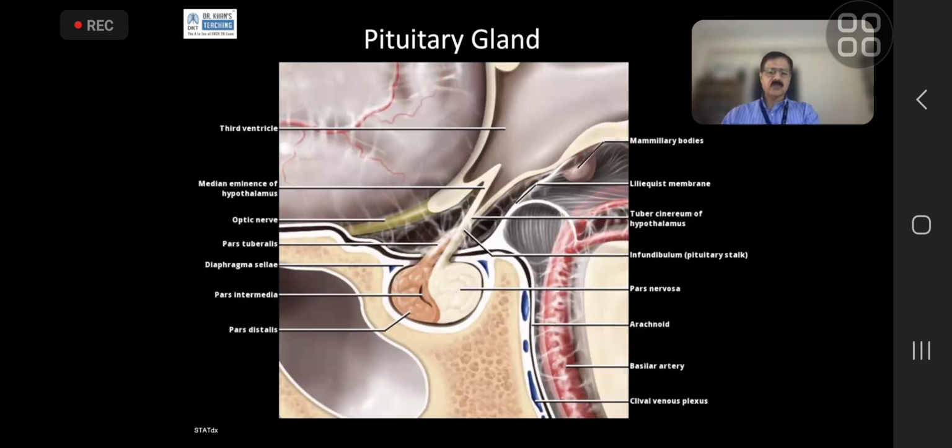From here, in this particular case, there was another differential diagnosis. Infundibular or suprasellar lesions, that's another. So this is the infundibulum. This is the floor of the third ventricle. This is optic chiasma. This is hypothalamus. There are various names here which you can remember. For example, tuber cinereum, and there is a perforated substance. No need of remembering that. Mamillary bodies you can make out, but just remember it as hypothalamus. So this is infundibulum, this is hypothalamus.